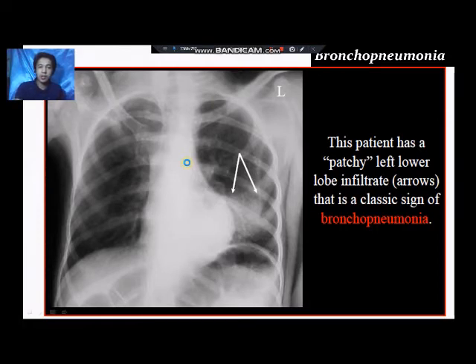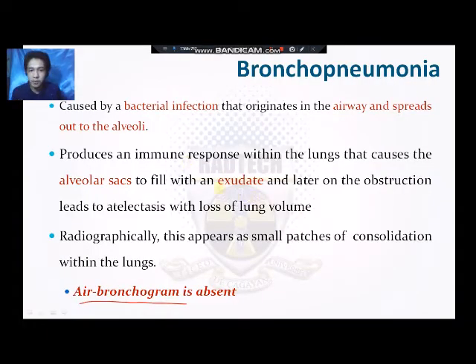Okay, so this is because of the exudate formation. Kibali na yung mga fluid that is filling out the air sacs, okay, so the alveoli of the lungs, and as this fluid accumulates, some of this fluid will flow back towards the bronchus of the patient.